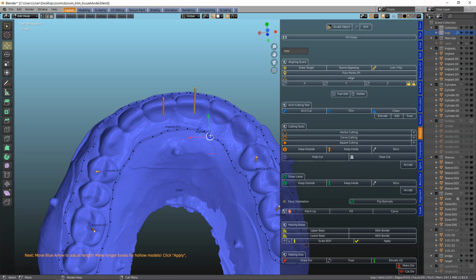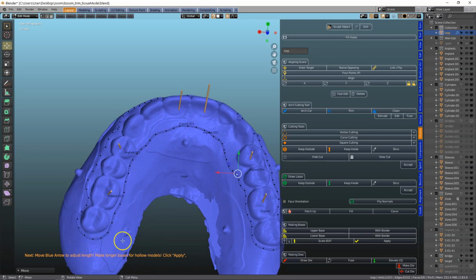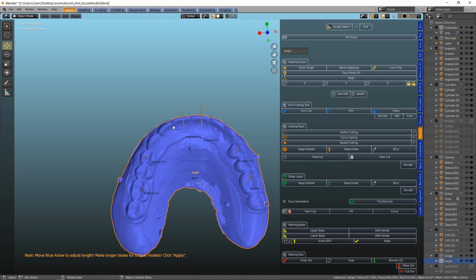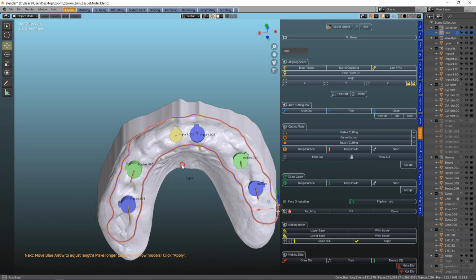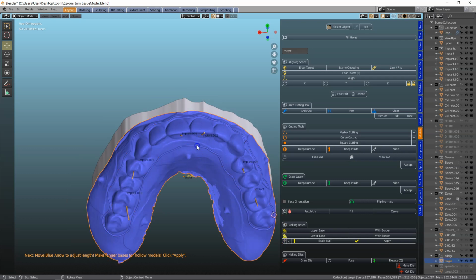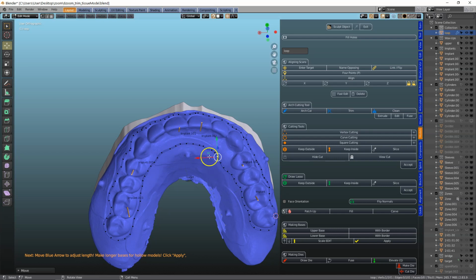Now in this case we're using the denture for making a bridge, but we could just as easily have made our own little denture using the wax up module. So I'll just make a little bit more space for us to then put something in. Also remember that if we need to make a tube that runs along this. So if I hide this, for example, I'm trying to explain in great detail how this works. So here we can see we're going to be making a tube running along this side. So we want to make sure we've got enough space there. So from the top, we could even bring this one in a little bit more. So that's what I'm going to do. Just use the G key in the proportional editing. And that should do the trick.